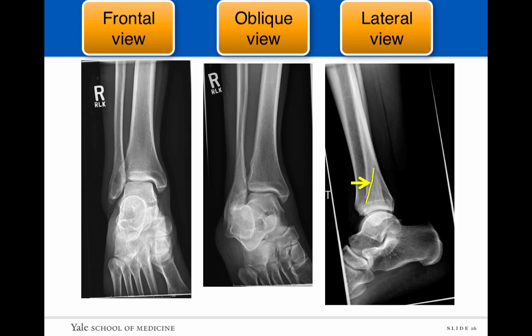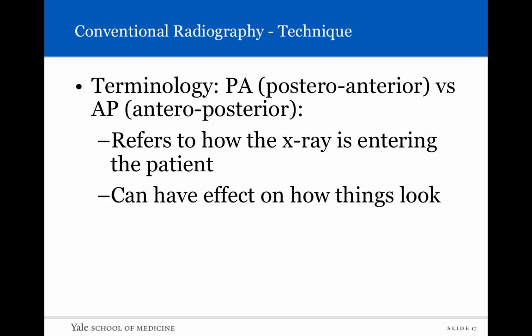Now, in terms of the terminology, this is important. We call a radiograph, particularly this is when we're talking about chest x-rays, PA versus AP.